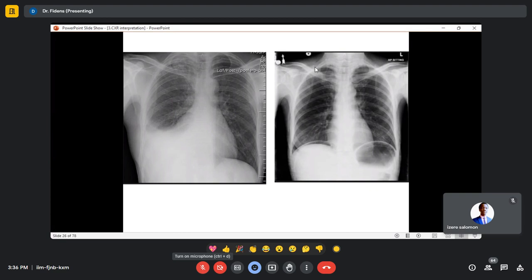This is an AP. It is even written there. That's PA, teacher. It is even written up. It is written AP sitting. Yes, AP sitting. AP. I wanted to see if you read all the details before you talk.